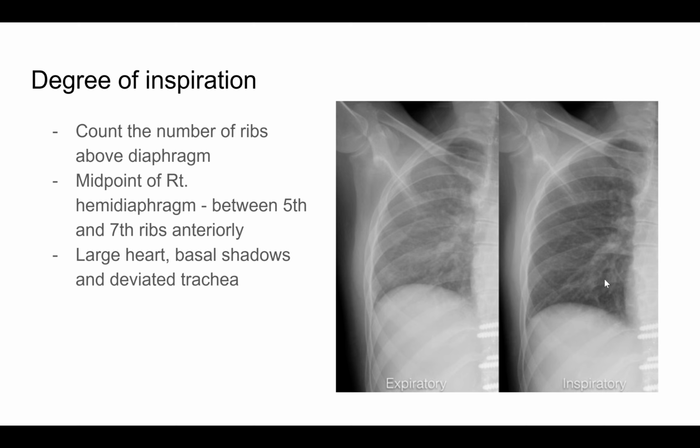There can be basal shadows, which can be confused with consolidations or pneumonia, and the trachea can be a little bit deviated as well. Thank you.